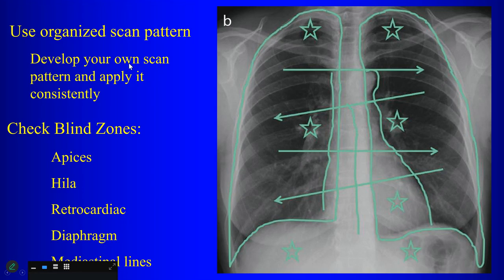Use an organized scan pattern. I would encourage you to develop your own scan pattern and apply it consistently. Use the same scan pattern on all your x-rays. Use the checklist. Approach them the same way, and if you apply your checklist, you will get faster and faster, but you will include everything and be systematic about what you want to look at.